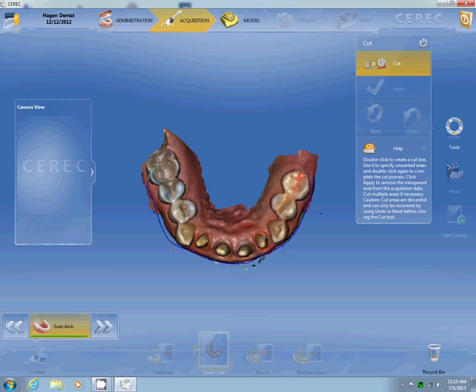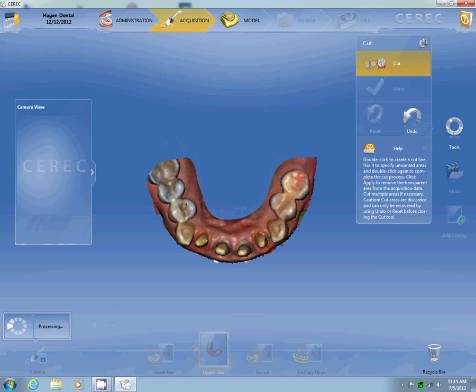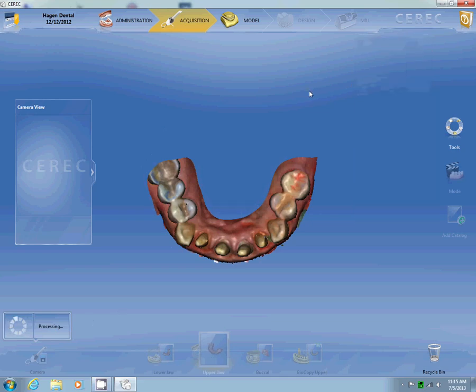We went through about half of this tooth on the other one. We trimmed off this artifact, anything that wasn't complete. We just tightened up the model here. And just go all the way around and include it all in one if you can. Click Apply. Your machine will run a little bit faster if you close this down while it's doing that. Then once that's complete, we're going to move forward again, and we'll see if the models will stitch together.